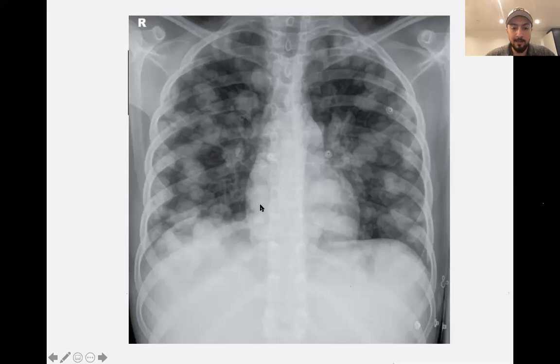Okay. The heart is not enlarged, and the diaphragm, you can see the costophrenic angle on this left side, but not really on the right side. This could be because the tumors are covering this angle, or because there is unilateral pleural effusion, which can also be caused from lung cancer. And everything else is fine. You can see some artifacts in here, so that could be, again, another type of artifact on the patient's chest.